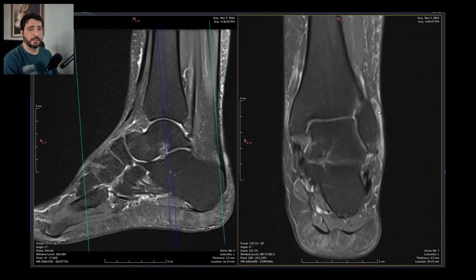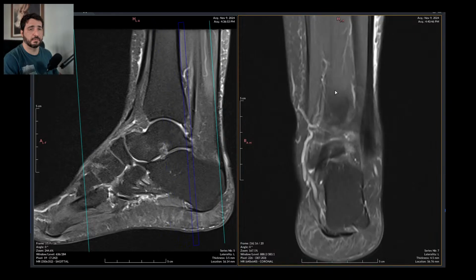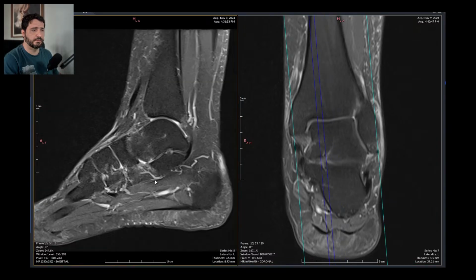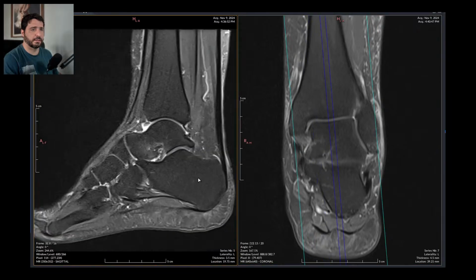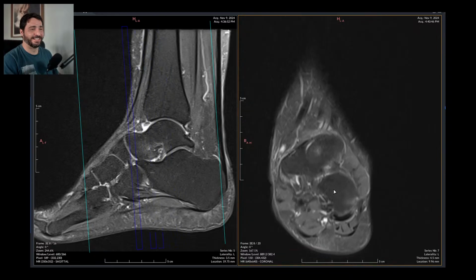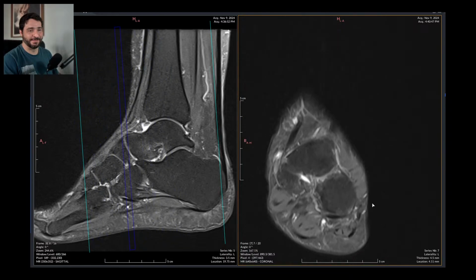There is clearly edema all over the ankle on the soft tissue parts. This is a very, very thick exam because they started too far away on the front, and they ended really before the tendon right there. This is so bad. Come on, man. It's a 4.5 thickness slice on an ankle. Man, they really didn't want to image anything here.